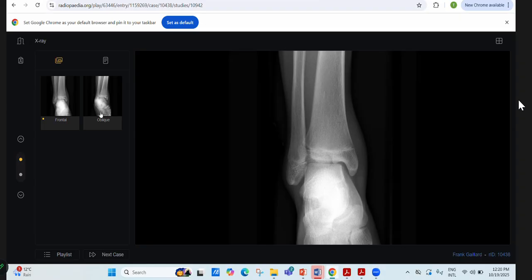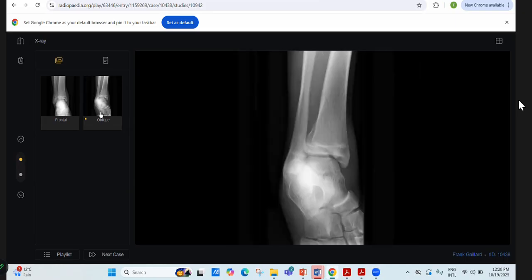When you see this view, what is your opinion right now? Ma'am, it is an oblique fracture, and it is going through the physis as well. Yes, so it is sagittal, it is transverse, and it is oblique coronal as well. So what is it now? It's type 4, going above and below and passing through. Yes, it is type 4, and its further name is triplane fracture.